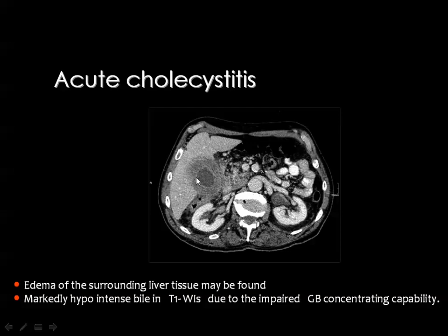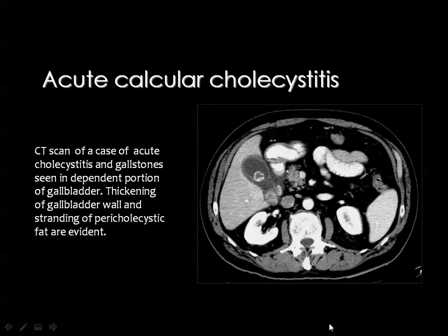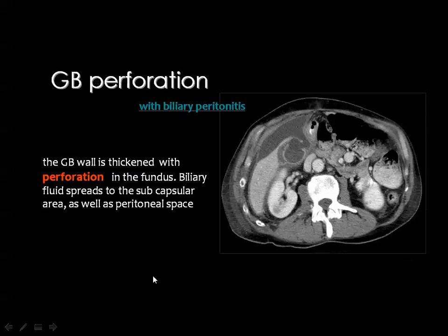This is the gallbladder with relative thickening of the wall and enhancement, and you see some fluid around the gallbladder itself, diagnostic of pericholecystic edema. And gallbladder inflammation may be associated with calculi and may not, and this is calcular cholecystitis. The gallbladder wall is relatively thickened and there is a stone inside the gallbladder.